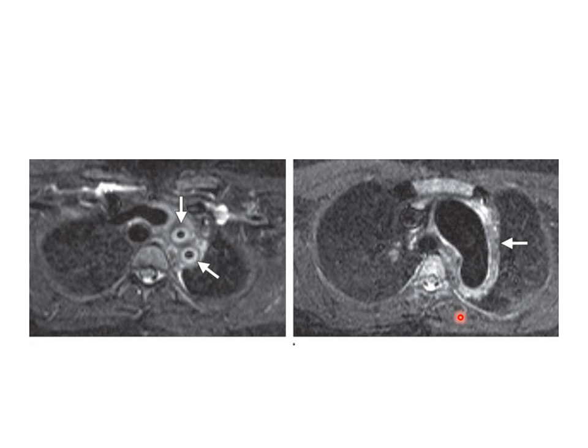As we can see, this is the MR of the patient. We can see also thickening of the aortic arch branches, which is left common carotid and left subclavian artery, and the arch, of course.